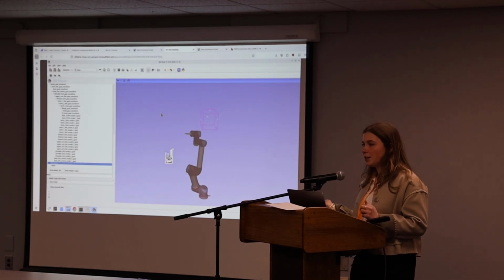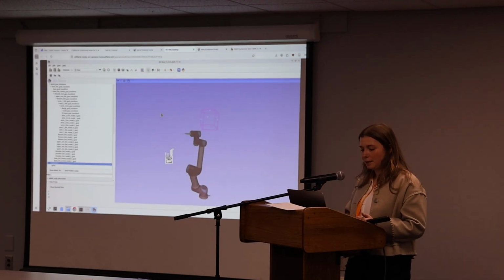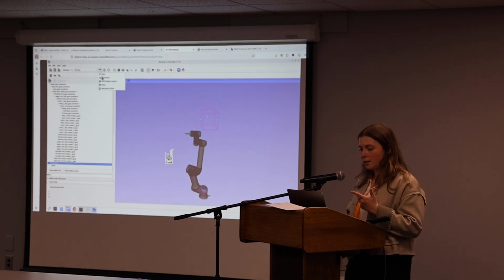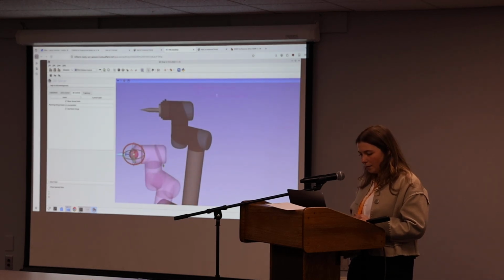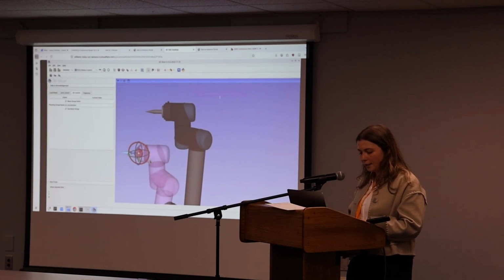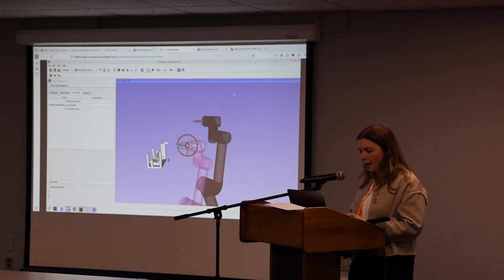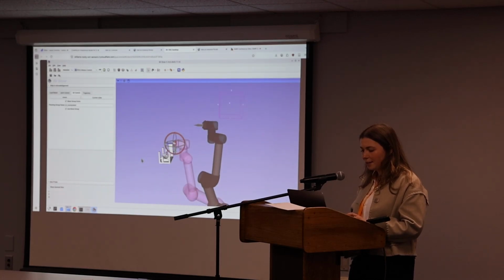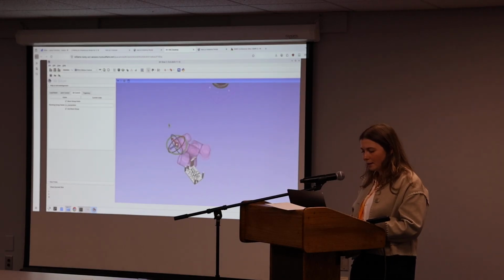This is pretty common for registration. You'll have a pointed stylus that you'll bring to target points to initialize ICP or something like that. And so if we go back to the ROS2 motion control, we can now plan with this end effector. So you'll see it's a little bit hard with the arrow. And if you zoom in, you can see our goal state robot has that pointed end effector as well. So we can actually drag this onto a point on our patient model. And you might have to orient yourself in the 3D views for a bit before you can get this working.